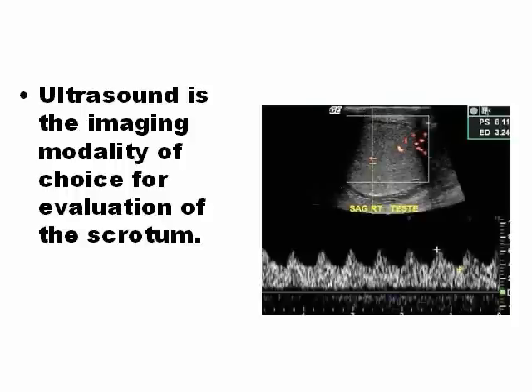Of course, ultrasound with Doppler evaluation is the imaging modality of choice for the evaluation of the scrotum. Nothing is better, nothing is safer than ultrasound in an important organ as testicles.